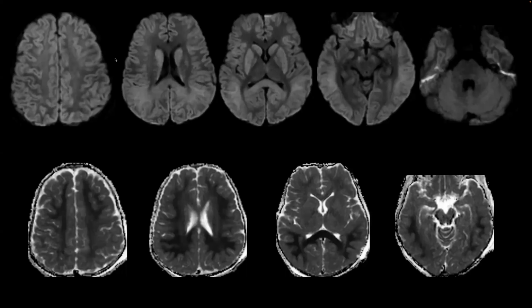So on the diffusion, we can appreciate extensive injury, predominantly involving the cerebral white matter, but also regions of the basal ganglia, the cortex, subcortical deep white matter, the corpus callosum, particularly the splenium, the optic tracts, optic chiasm, and the cerebral peduncles. On the ADC sequences, you can better appreciate the areas of cytotoxic confluent edema, with predominant involvement of the subcortical deep white matter, also involving the splenium of the corpus callosum. The basal ganglia changes on the DWI do not show the reversal on ADC sequences.